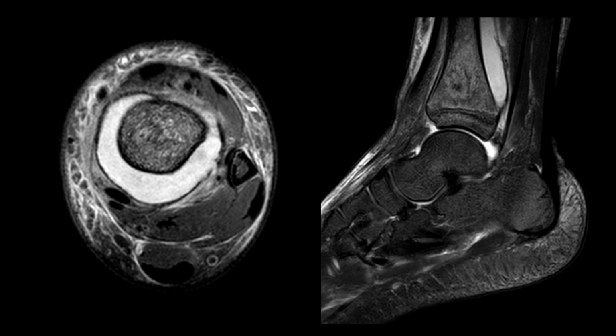In the MRI, it's much easier to see. We have the distal tibia, and we see this large kind of high T2 signal intensity collection, which is pus, between the bone of the tibia and the periosteum. So it's a subperiosteal abscess. And this happens in osteomyelitis of the children. Osteomyelitis is right here all throughout the distal tibia.